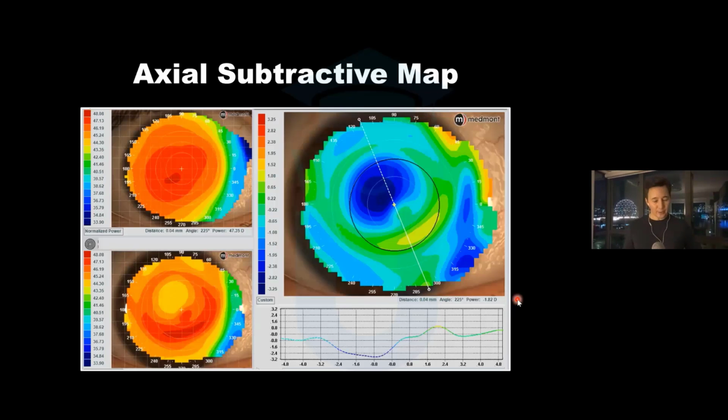Now, what are some of the other outcomes that we have in orthokeratology treatment? And one of them is this, where you see the blue treatment zone decentered high in relationship to the pupil. So I put that dotted line around where the pupil border is, and you notice how the blue treatment area on the axial map is high.